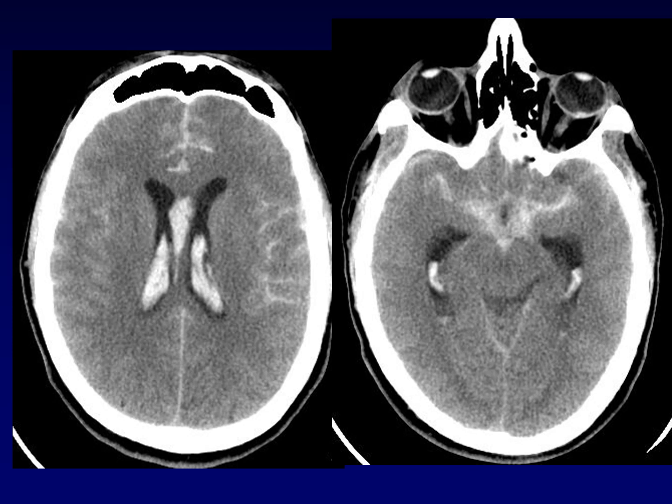Here is an example of hemorrhage in a different space. Here the hemorrhage is filling the ventricles and it is following along the sulci. Normally, we should see the sylvian fissure here. It should be dark like the other water that we're seeing here, the CSF. Instead, it is replaced by this dense material. That's the clotted blood. And you can see it up front, following along the sulci.